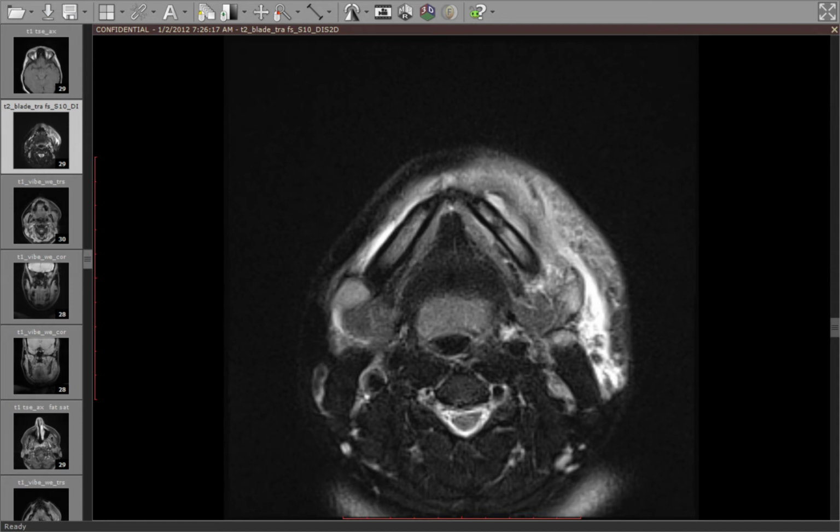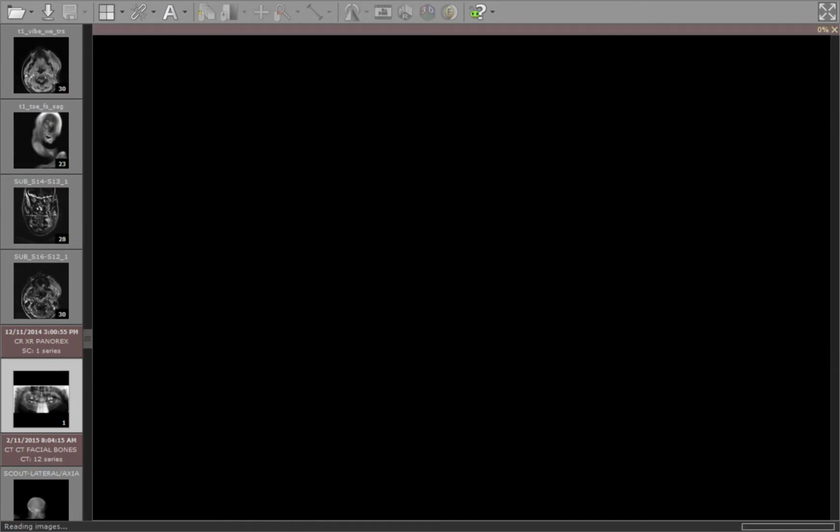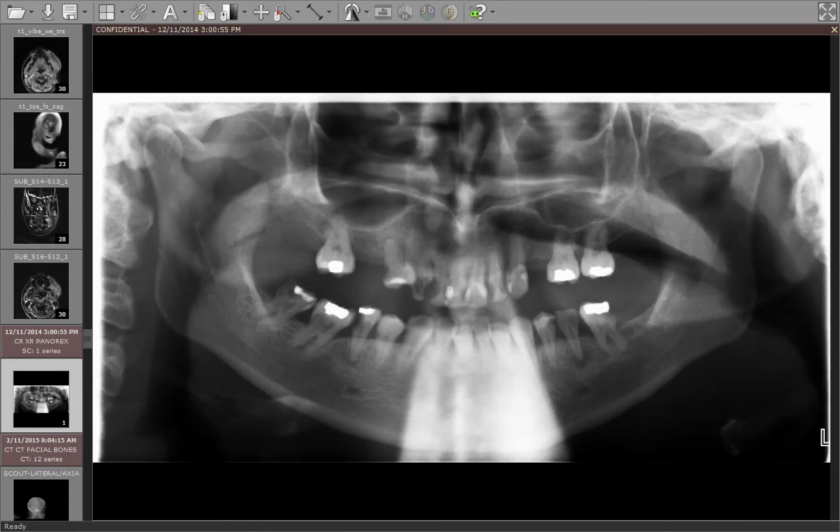Now, they did get oral surgery involved in this case, and oral surgery ordered this panoramic radiograph, and the problematic tooth was this left mandibular second premolar, and there's a periapical radiolucency, there's coronal lucency, all compatible with decay.